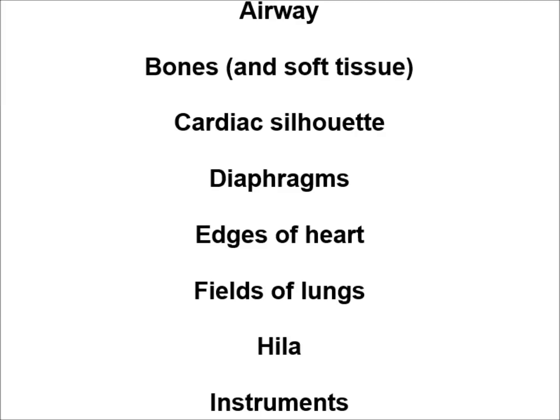F. Check the lung fields for normal lung markings and abnormal shadowing. H. Check the hilar for lymph nodes or masses. And I. Look for instruments.